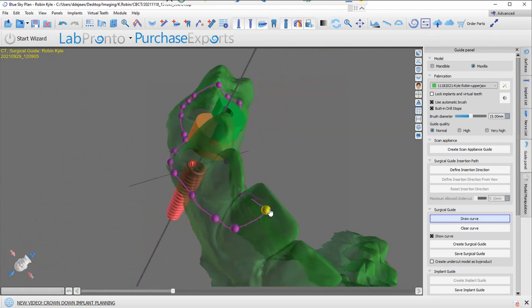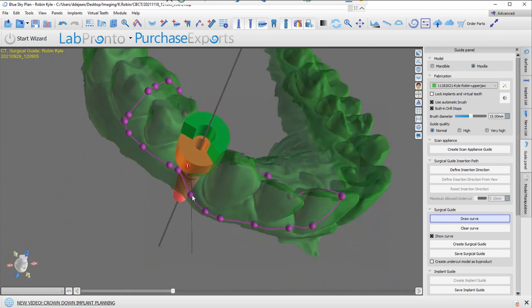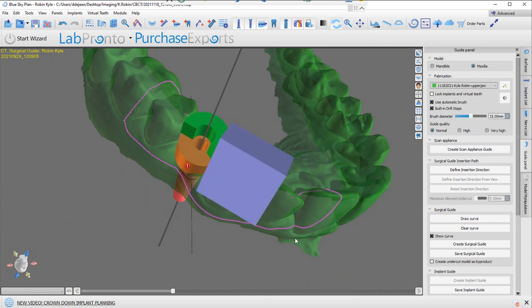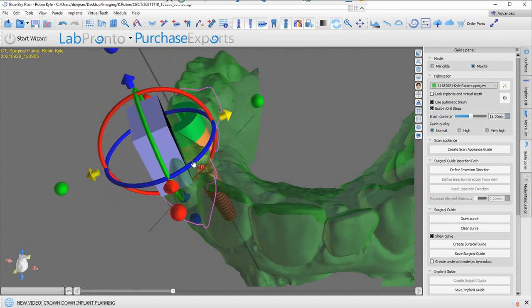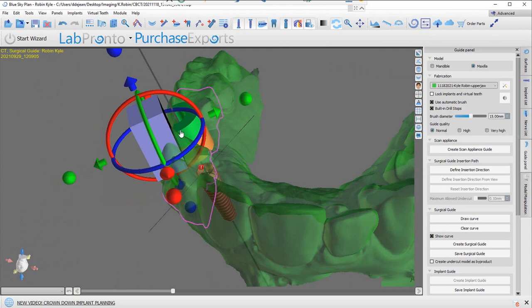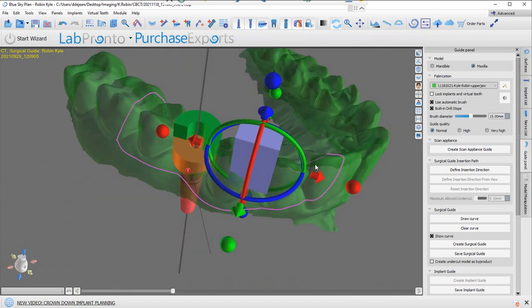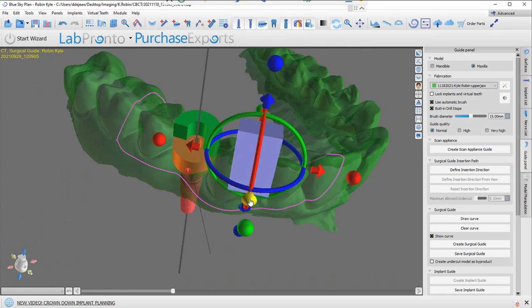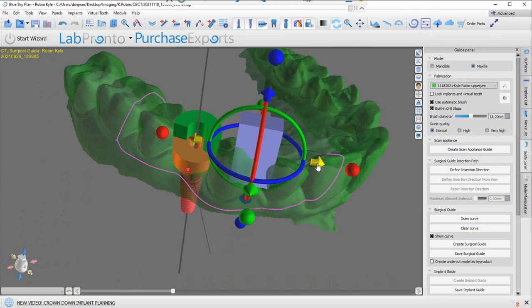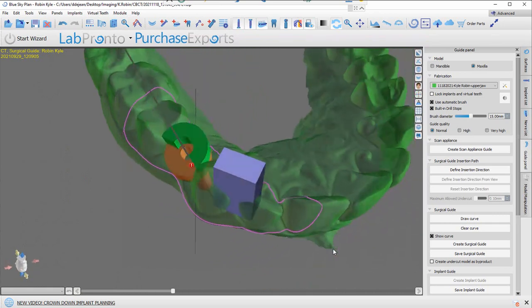Sometimes people want to create windows for their guides. So what you should do is, just to make sure it's seated, you want to right click, add a window. And then you just have to change what it looks like. Like so. All right, that looks about right. Just need to make sure I have enough thickness around it.